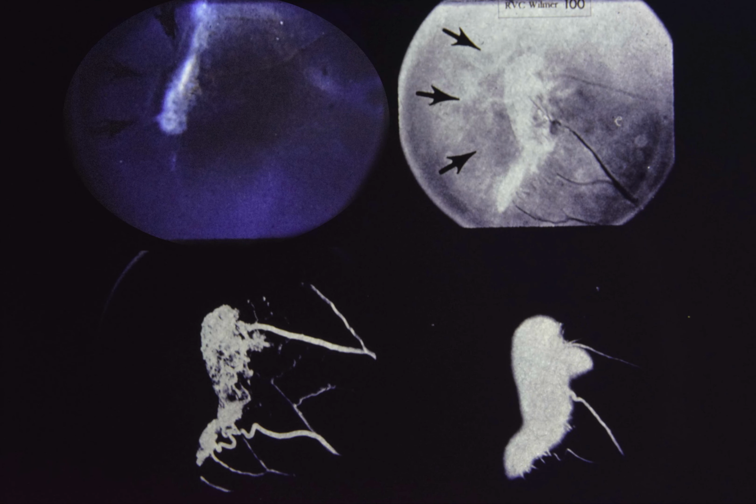Slide 100, quiz slide number 6. This 21-year-old black male has had recurrent vitreous hemorrhage in the right eye. Upper left is a representative area of the temporal fundus, right eye. Upper right is a photograph of the same area taken in red-free light. Lower left photograph is taken 10 seconds after dye injection, and lower right photograph is taken 49 seconds after injection.